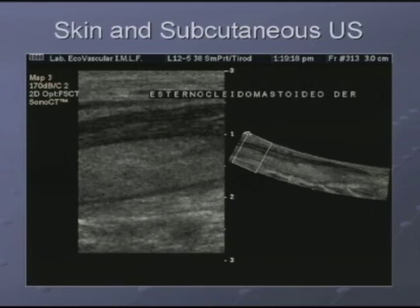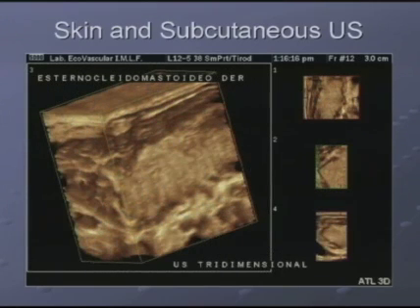And here another view by using the zoom of this same example. And here the three-dimensional reconstruction where we can observe the superficial structure here. This is the muscle and this is the affected area.